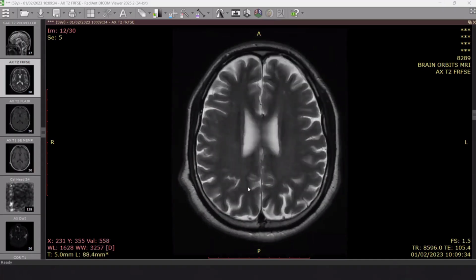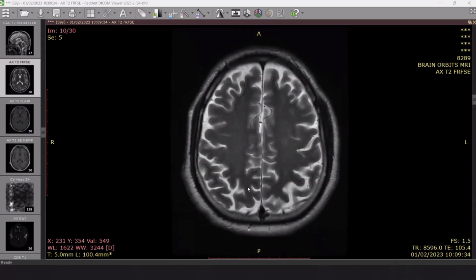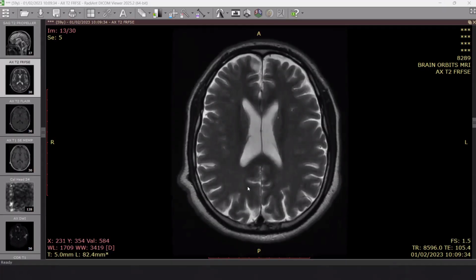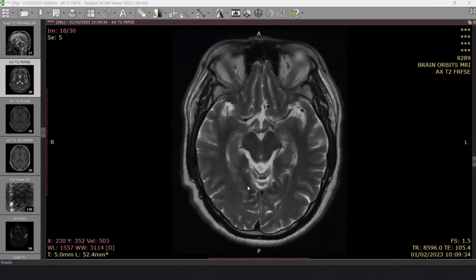Yes, very nice. So upwards, there is mild dilatation of the ventricular system and the extra spaces also, that can be age-related involutional changes if the patient is an adult, old-age patient. Some prominence of CSF spaces is also noted.